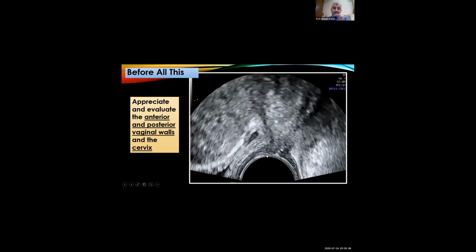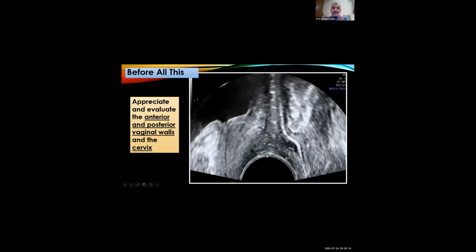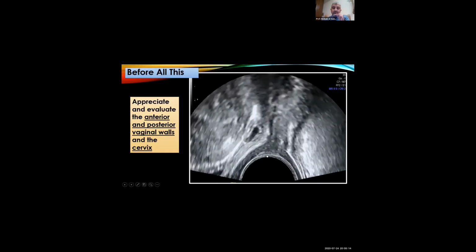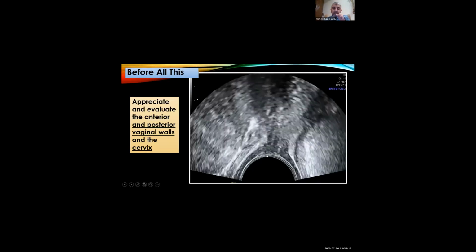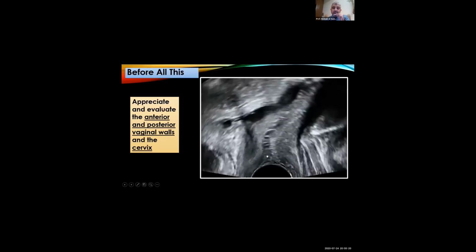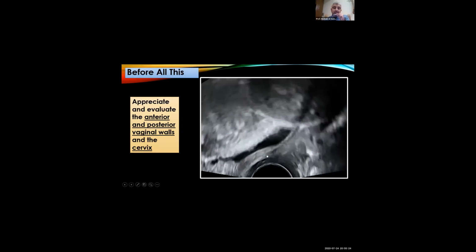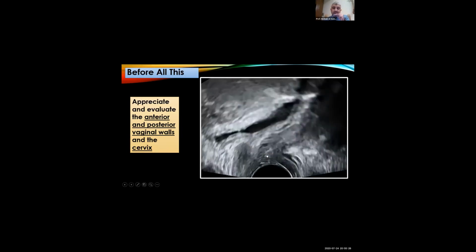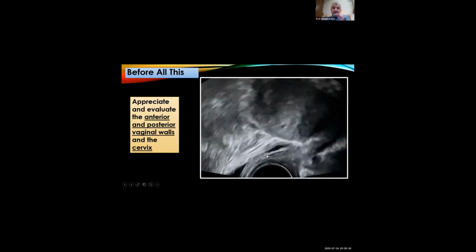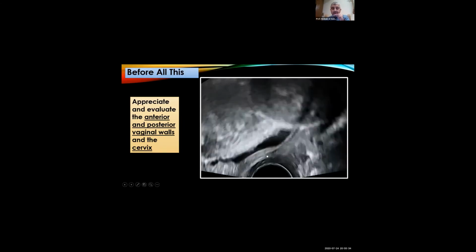Of course, doing a speculum examination will give you an idea about what is the diagnosis, but not to miss them, an ultrasound scan is better, by performing your scan just outside the vagina. And sometimes you could see a cyst inside the vaginal wall, and this cyst could be either an embryological cyst, a developmental cyst, or it could be a site of endometriosis, and could be a site of dyspareunia for the patient.